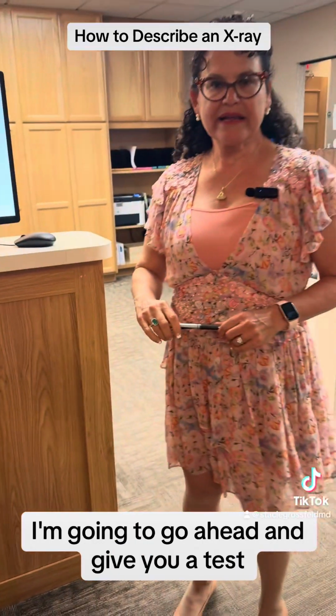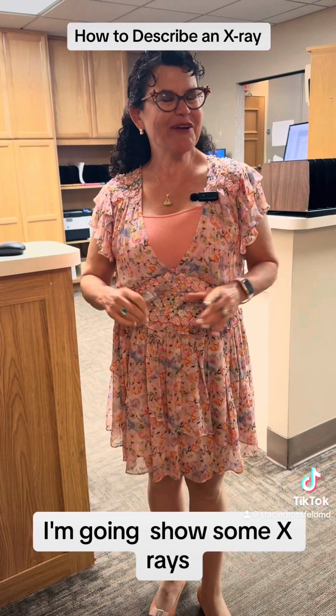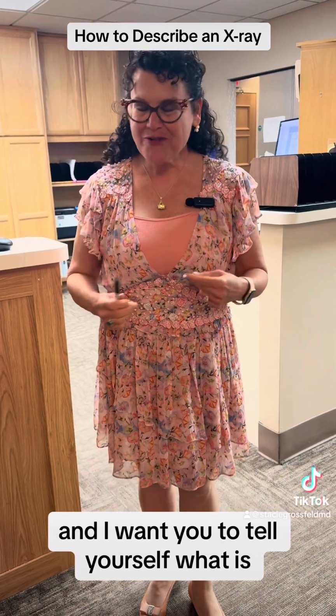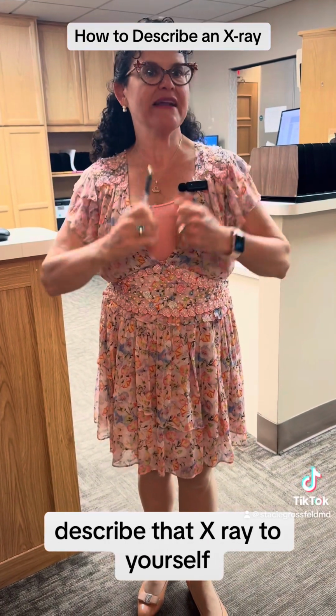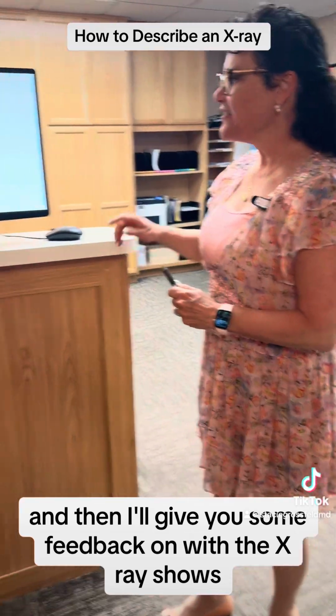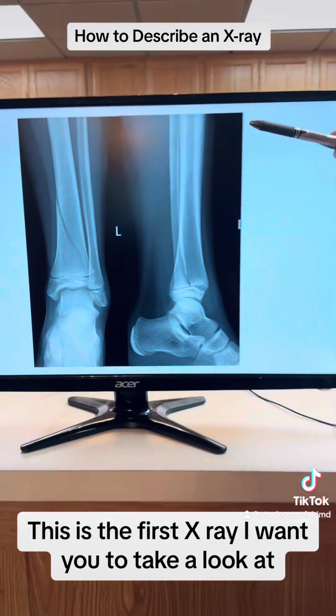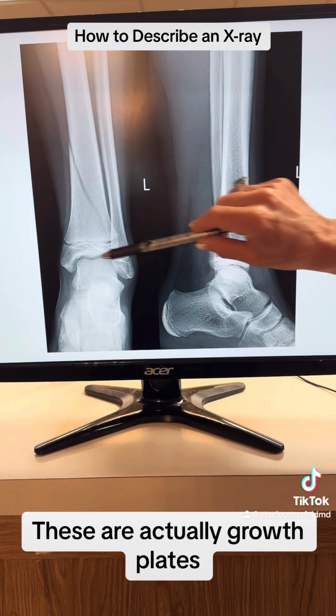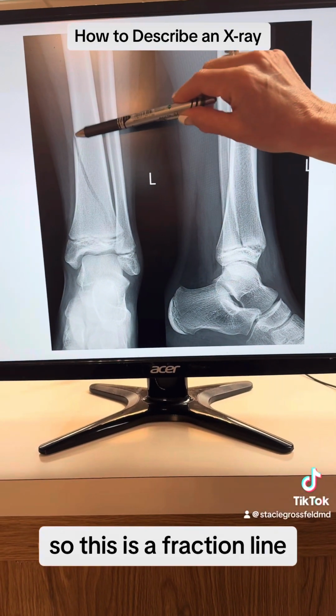I'm going to go ahead and give you a test. I'm going to show some x-rays, and I want you to describe that x-ray to yourself, and then I'll give you some feedback on what the x-ray shows. This is the first x-ray I want you to take a look at. This is the fracture line right here. These are actually growth plates. It's a pediatric patient. So this is the fracture line.